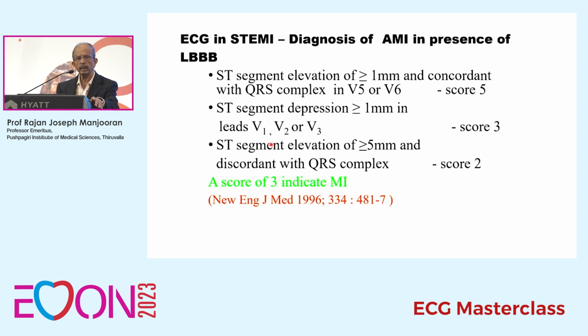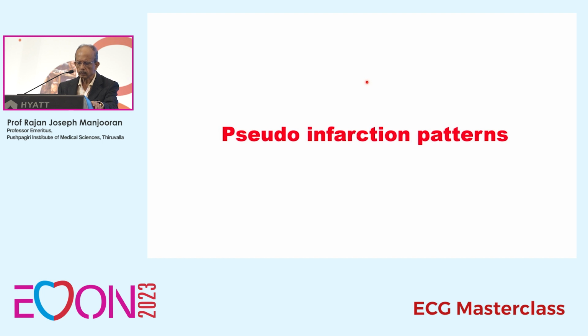And there are a number of electrocardiographic situations where you can diagnose trifascicular block from the surface electrocardiogram. I have enumerated 9 of them. For MD students, this question may probably not be asked, but if there are DM students, definitely you can go through that. Okay, I think I will go to the pseudo-infarction patterns.